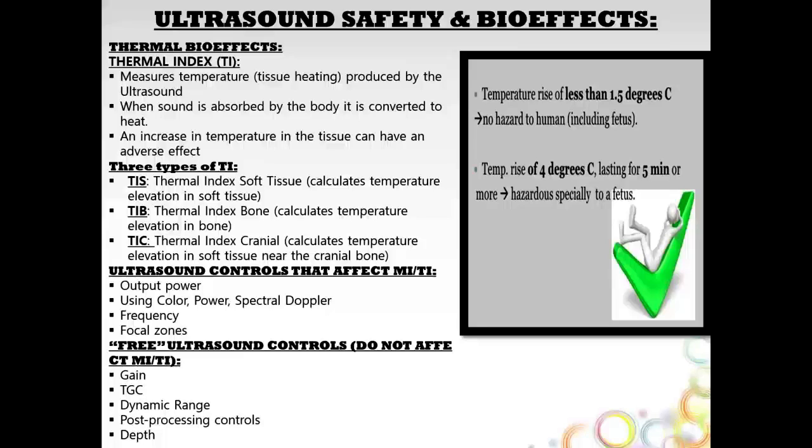The free controls, so these are not going to affect the MI or the TI settings. This is going to be our gain, TGC, dynamic range, any controls that are post-processing controls, or controls that are manipulated when the image is frozen, and also our depth.